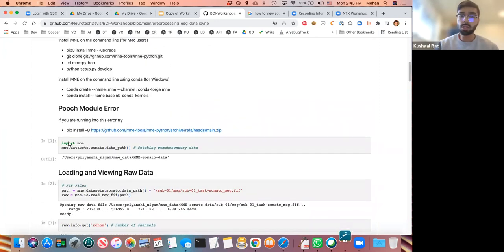And the first thing we do is we say import MNE. MNE is a signal processing library for brain data specifically. It allows us to do EEG data, EMG data, MEG data. They have all sorts of nice handy functions that are easy to use that we would commonly use when interpreting any sort of physiological signal.